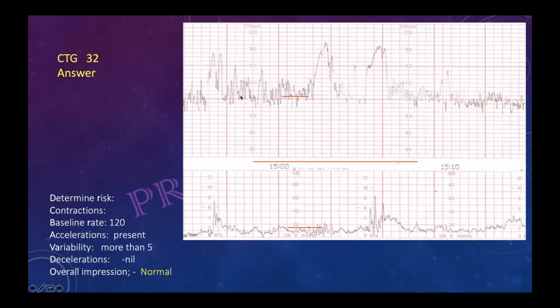Variability is going more towards acceleration. It should last for 15 minutes, which is not happening. In some places I agree it is at 25, but it is not lasting for 15 to 25 minutes. Everywhere it is not 25 boxes. It is just variable.